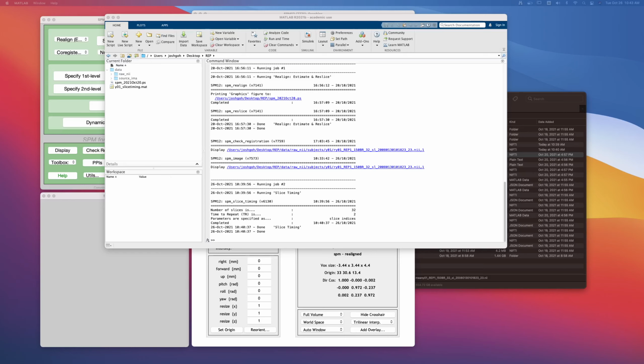So for motion correction, it's rigid body, but all the images are in the same modality. So you've got your EPI registering to the other EPI in a rigid body way because it's from the same subject. In this case, it's also from the same subject, but one image might be an EPI, but another image might be a T2.